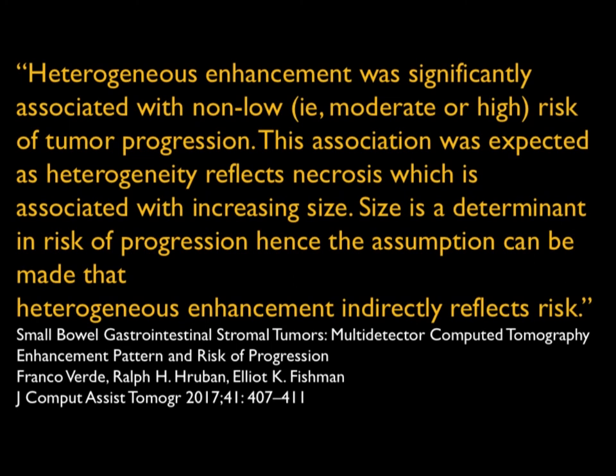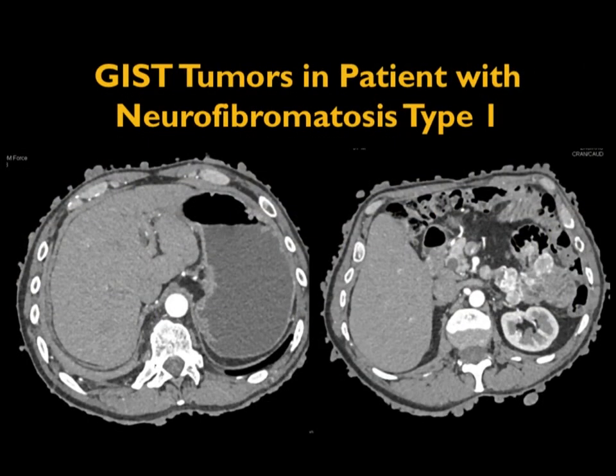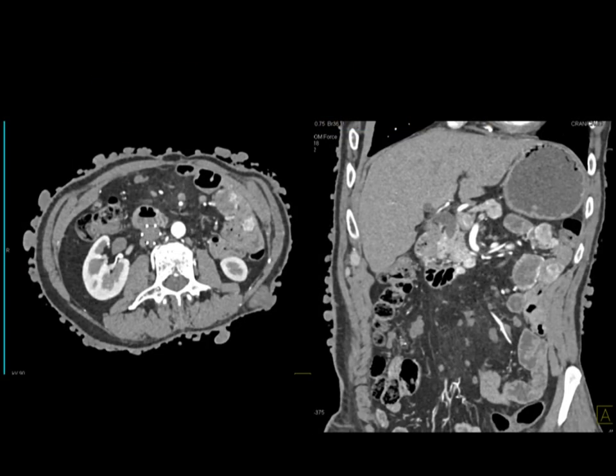Now, there have been several other things that relate to GIST tumors, and I thought I would comment on them. Most GIST tumors are going to be spontaneous, but they can be associated with certain things, and one of them is neurofibromatosis. I commented on that before, and we'll speak about neurofibromatosis in more detail on another day, but look at all the skin lesions. Then we go down, look at the lesions in the peripancreatic region.